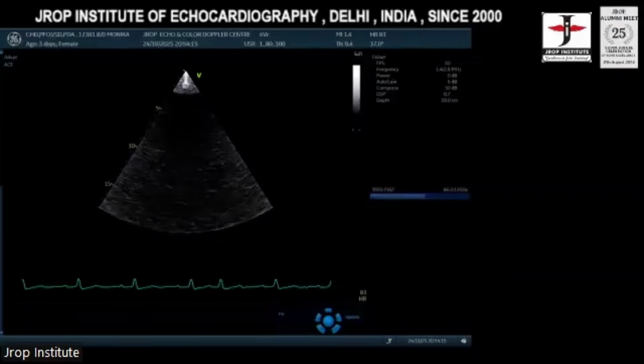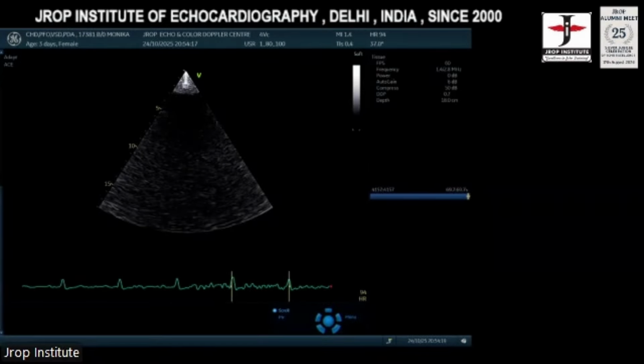Good evening, sir. My question is, when you did that TR tracing of the subject, how did you change the tracing graph to a gray background so that it was more easily visible? That is known as the color map on the screen.